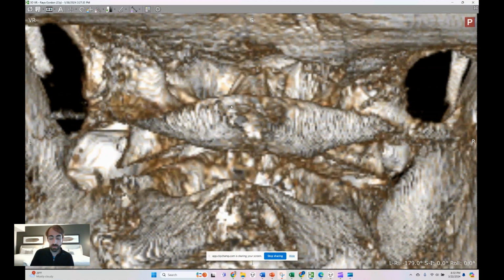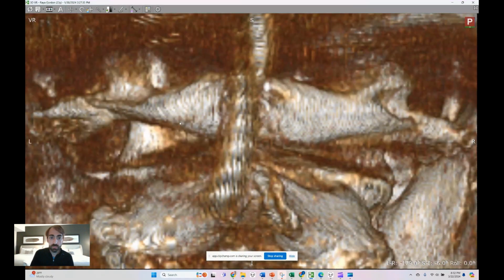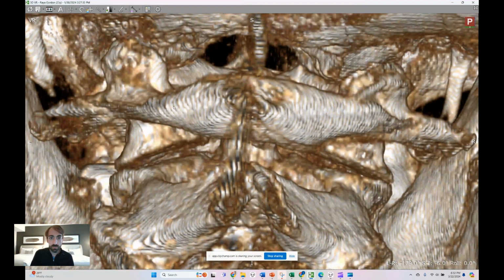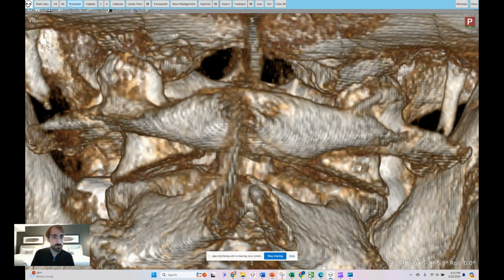And then let's go ahead and zoom in on our S line, get our shading right. Alrighty, so open Toolkit, clear all, horizontal angle, high on the left, 4.76, the top of the atlas, high on the left by 5, bottom of the atlas, high on the left by 2.7.